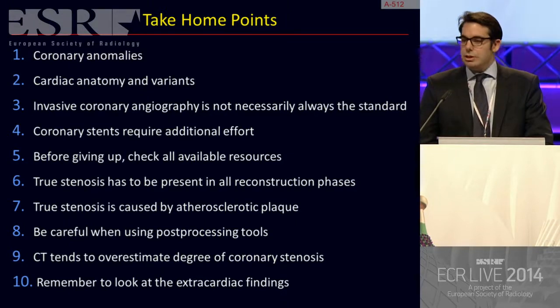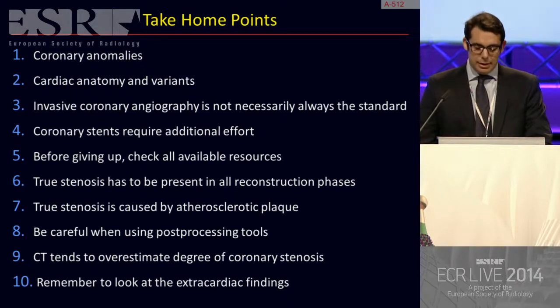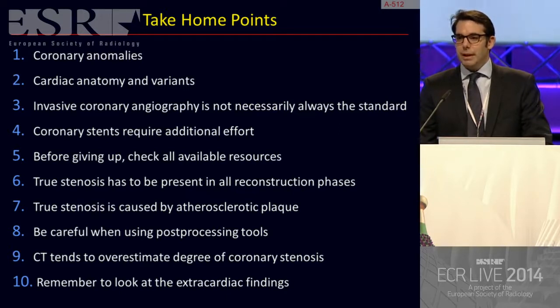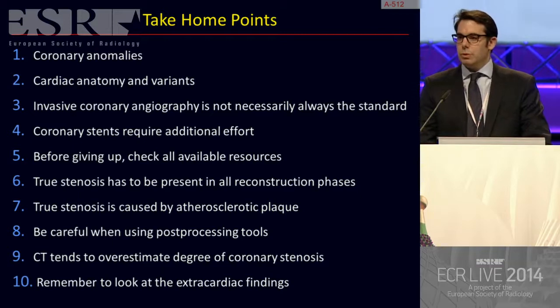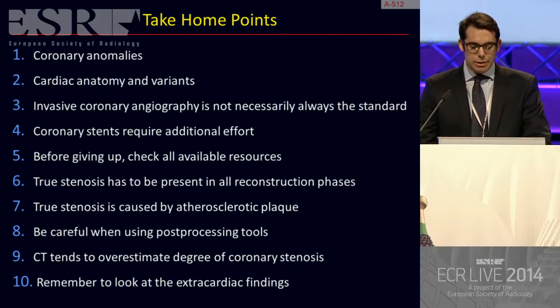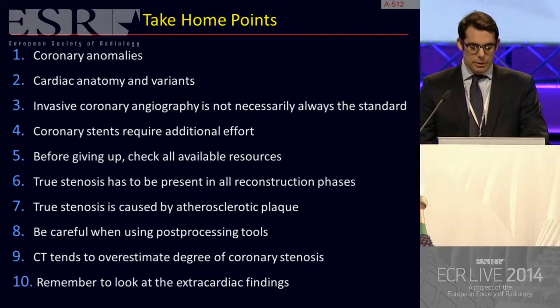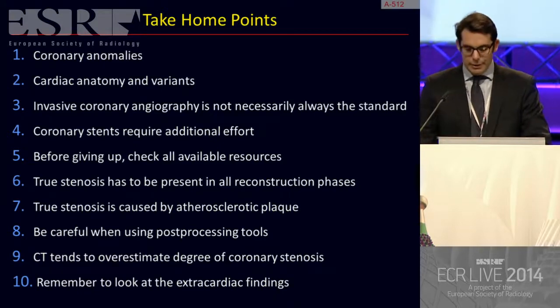A true stenosis has to be always present in all the phases. Remember that. That's a nice case. A true stenosis is caused by a plaque. If you don't see a plaque, that won't be a stenosis. Be careful when using post-processing tools, particularly volume-rendered images and curved planar reformats. CT tends to overestimate the degree of coronary stenosis, as in the case that we saw. And always, as radiologists, remember that we have to look for extracardiac findings. Thank you very much.